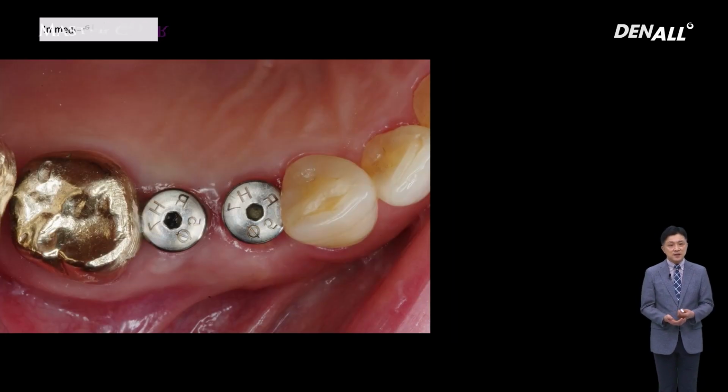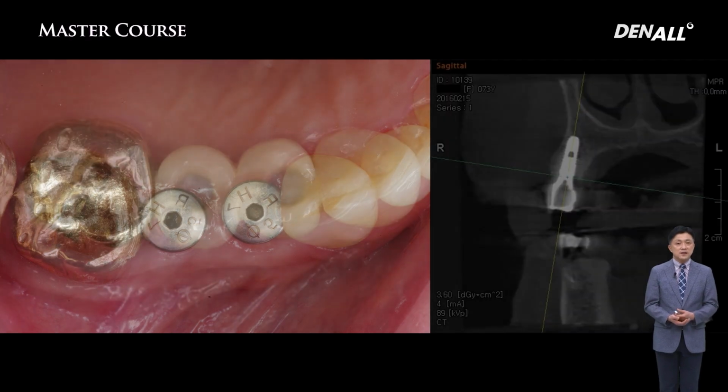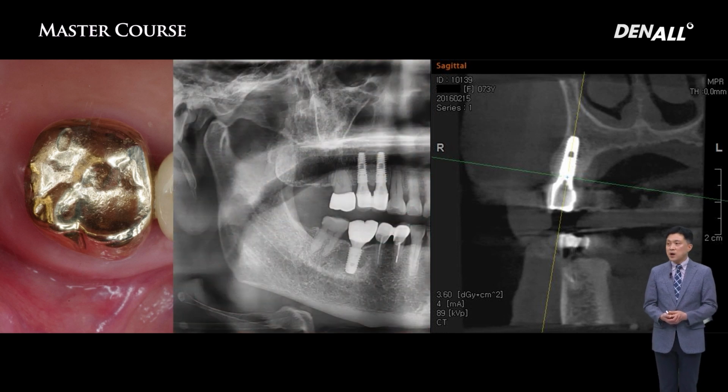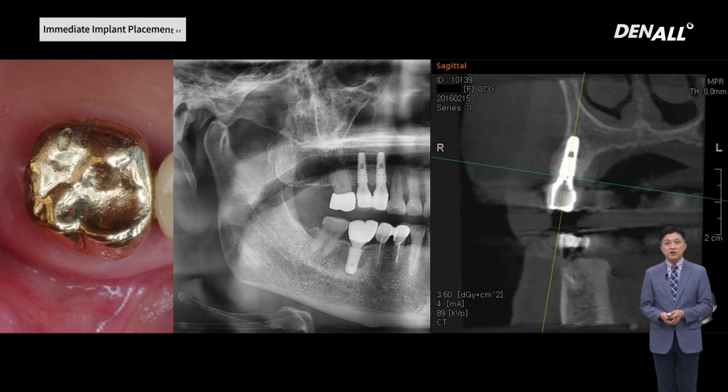This is after healing. In my case, I provide the prosthesis 16 weeks after surgery. This is the CT at the time of prosthesis delivery. This is the panoramic image. At the time of prosthesis delivery, you can see ideal contour and ideal buccal bone.